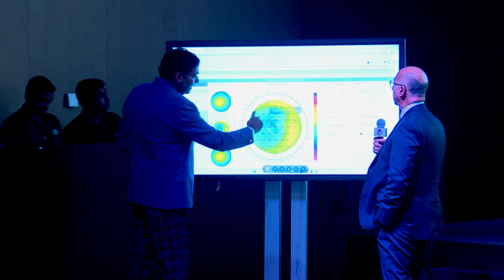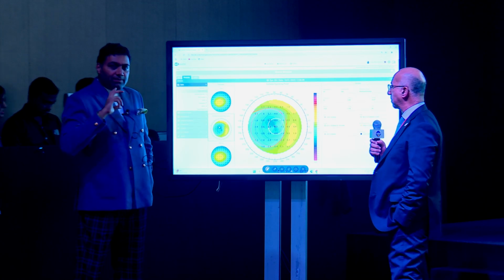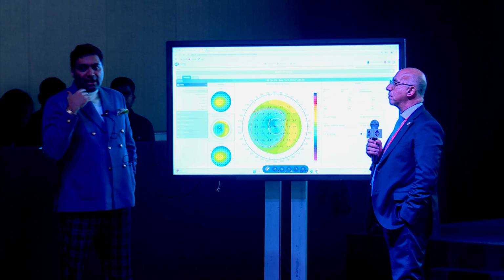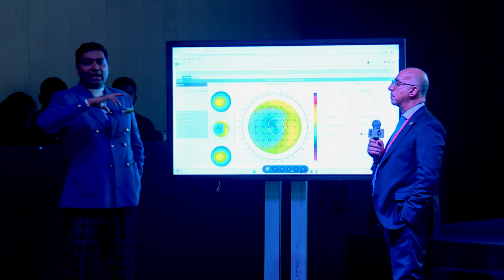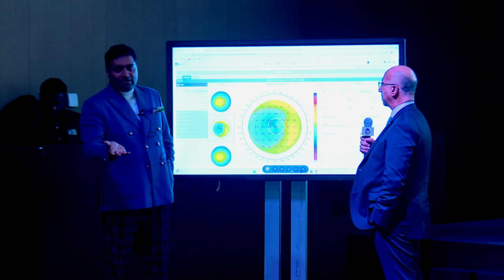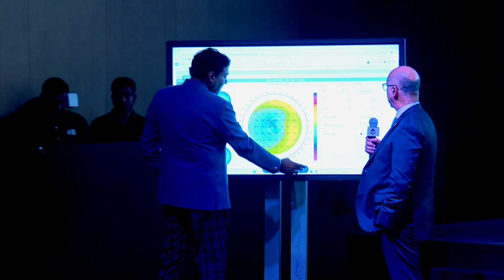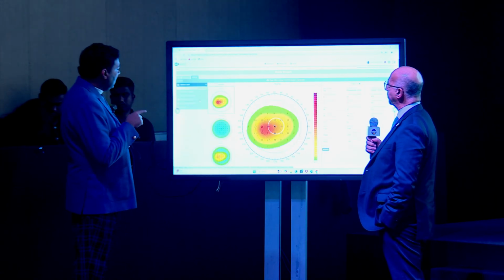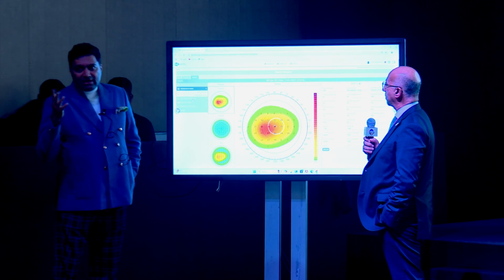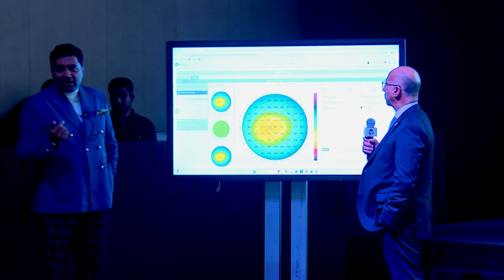This is keratoconus. That is one of the reasons why we have a lot of challenges in doing a perfect topo-guided treatment, because we have not factored in how the epithelial ray tracing happens and how it has an impact on the healing. But if you want to see the predicted outcome after you're done with the treatment, we have to go back and look at the predicted post-op ray tracing of the epithelium, because in my limited experience in a month, it closely matches what he says. In fact, I was not a believer.